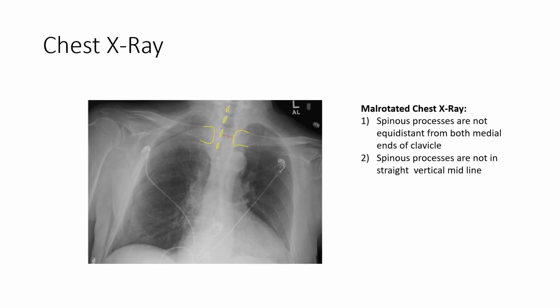Same goes here. Spinous processes are not equidistant from medial ends of both clavicle. Spinous processes are not in straight vertical midline as well.